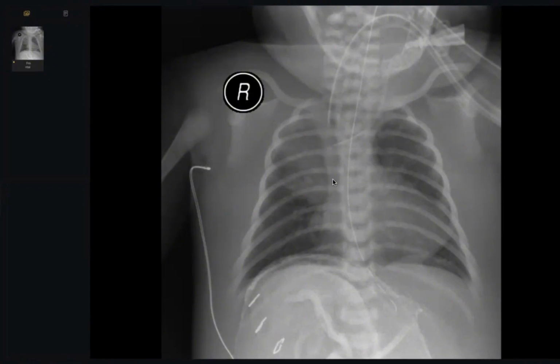Thank you, doctor, so much. See, my colleague, how to be sure this is valid. Look here, the apex is elevated upward due to right ventricular hypertrophy. And you must find concavity here. Why? There are very, very small pulmonary arteries. This is the aorta, and here must be the pulmonary artery, the aortopulmonary window. If there is no pulmonary artery here, it must be concave.